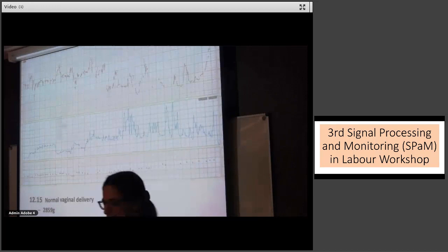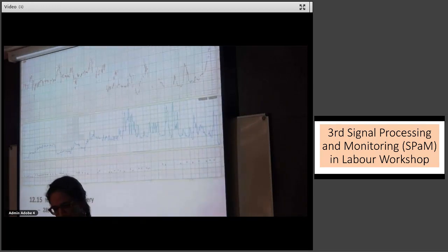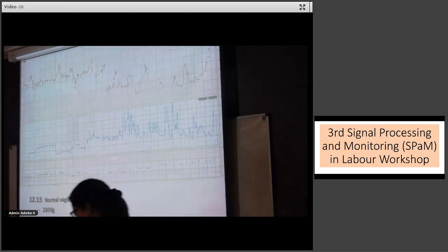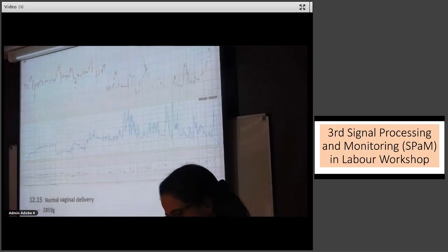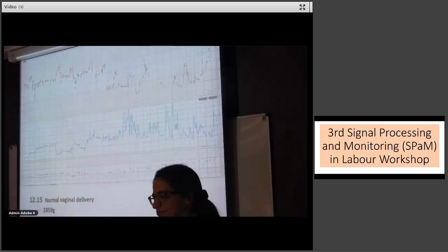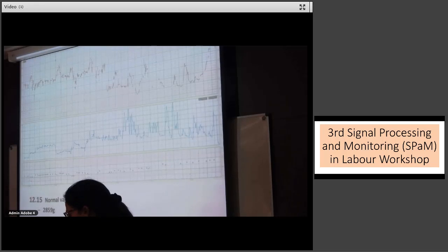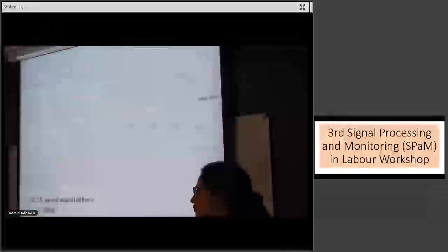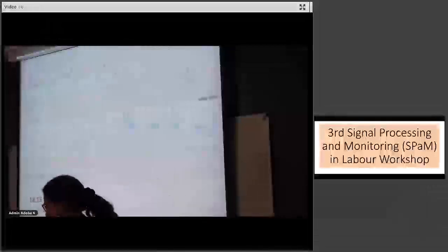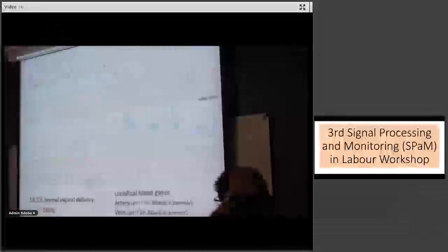What do you think about the cord gases? I think the gases will be relatively low, but I think it will be more of a respiratory acidosis rather than metabolic. In other words, if you look at the carbon dioxide tension, it's likely to be in double digits. Barry? You mean between the arterial and venous? Yes, I would say so, because I think most of it will be carbon dioxide accumulation. Okay, so these are the blood gases.